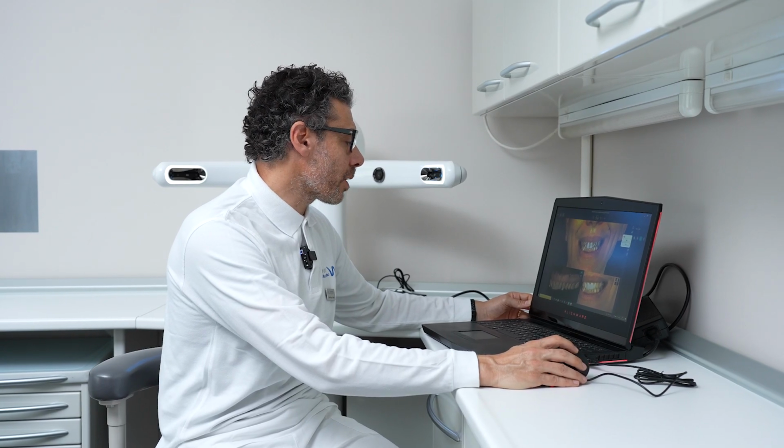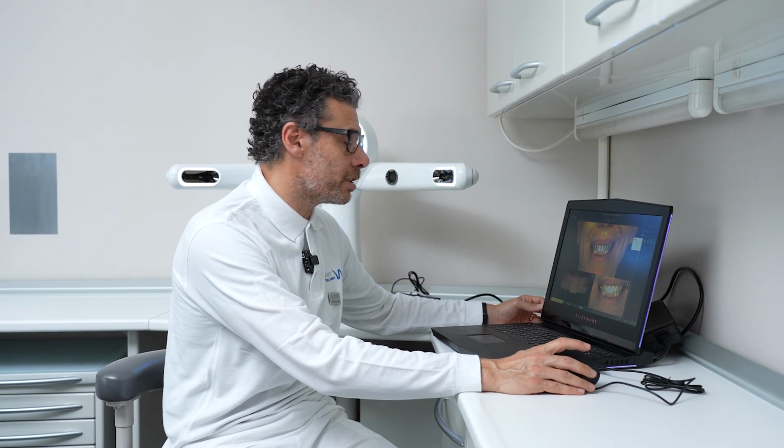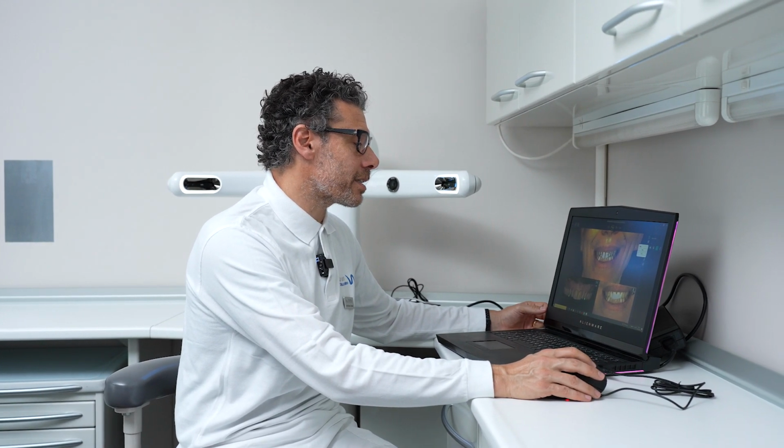If you have instead of the canines, you can use those as well, or possibly use the scan.